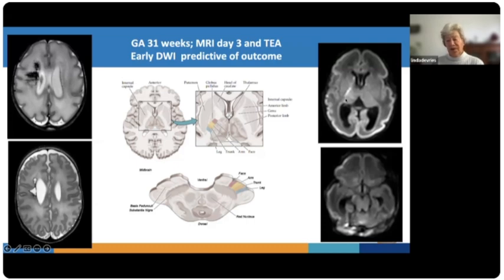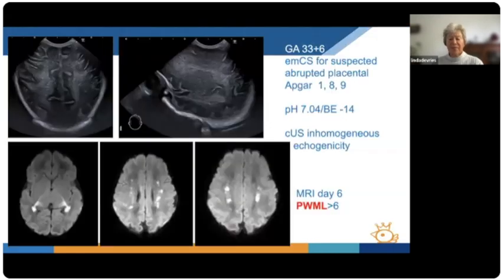So we know already in the first week that the child is going to develop a hemiparesis, and we also see a little bit of highlighting of the cerebral peduncle. And this is at term equivalent age, the cystic evolution, and the child on another level also had asymmetry of myelination. So here it can also definitely be very helpful to have an early MRI.